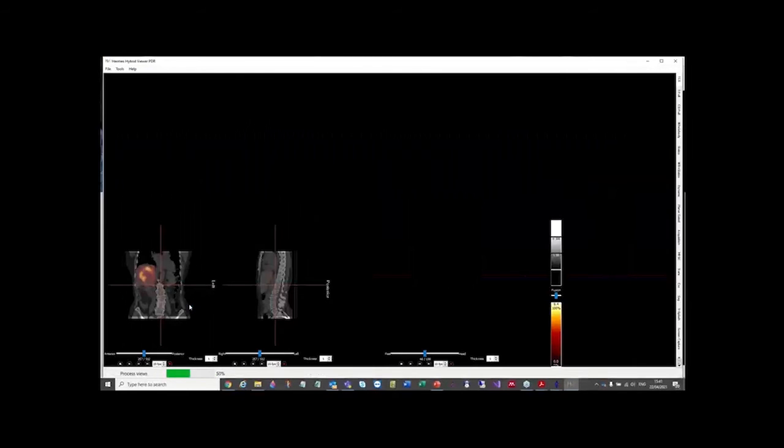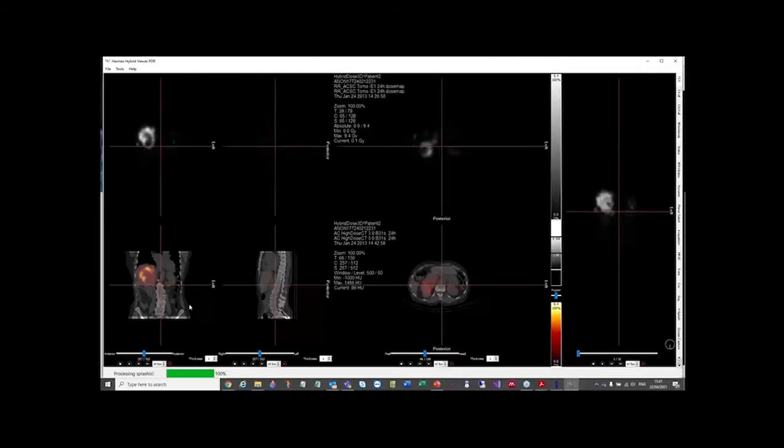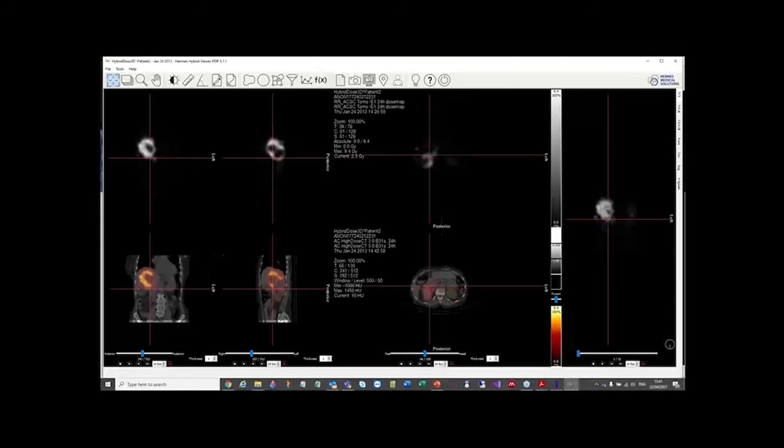So let's say that we've got in here a standard amount of lutetium. Like this, the time to first scan in this case is 24 hours. Let's just crack on with that. I'm going to click calculate. What's happening now is that it's doing, first of all, an integration at the voxel level, point by point. Okay, it's done. That's the dose map you're looking at now.